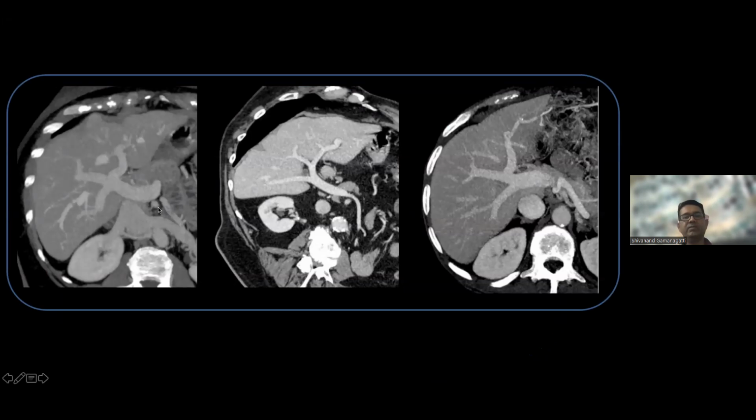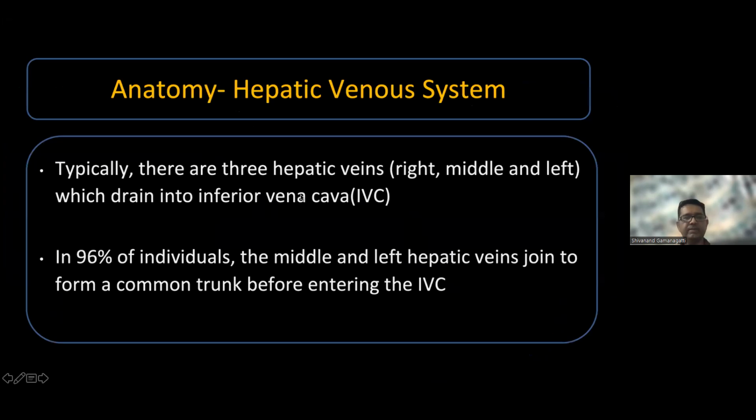Like the hepatic artery, the portal vein has a lot of variation. It is very relevant if a patient is undergoing hepatic surgery or portal vein embolization. Otherwise, it is just of academic interest. I will not go into further detail.